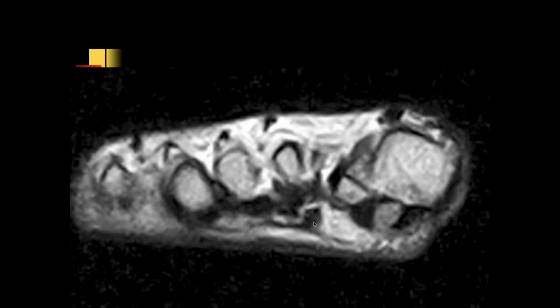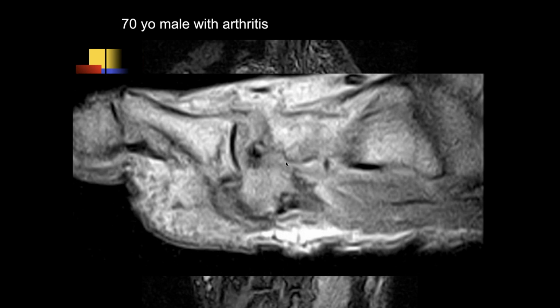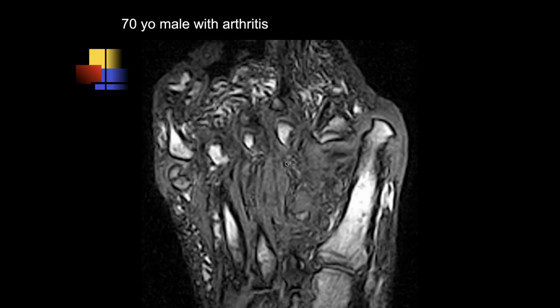Yeah. If you go to that, oh, sorry. That first image, I thought there was polydactyly. Right, because you've got lateral dislocation of the toes with respect to the first metatarsal there. I can assure you that this foot is very, very painful. Yeah. And what would one of our fellows do to treat it? Probably be difficult to find appropriate footwear too. That's correct. You cannot find it.